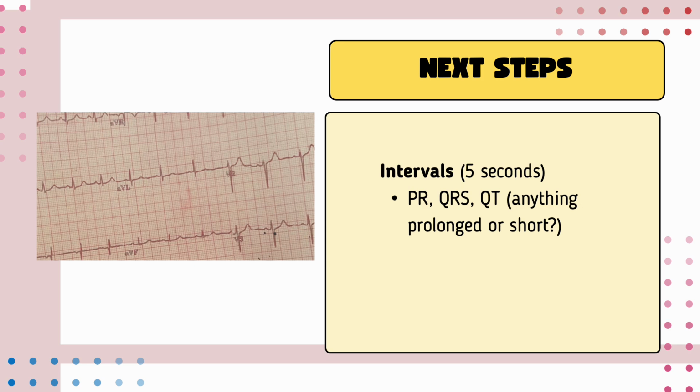We know that tachycardia is heart rate above 100. So you'll be having a wide complex tachycardia, which will be a ventricular tachycardia. More on that later. But just check: PR, is it between 3 and 5 small squares? Is a QRS not more than 3 small squares?